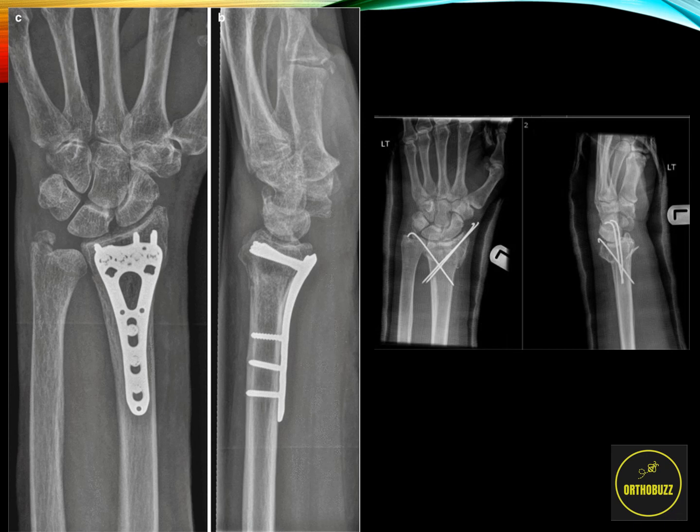Operations that we may perform could be percutaneously placing wires, similar to what we did for supracondylar fracture fixation, and then placing the patient in a cast, which you can see here. And the fracture will heal in the position that it is placed in, and the wires can then be taken out several weeks later. The other option is to perform an open reduction, where we place an incision, see the fracture fragments and reduce them directly, and then place a plate over it with screws to hold it there, which will stay forever in the patient. This is the other option as well.